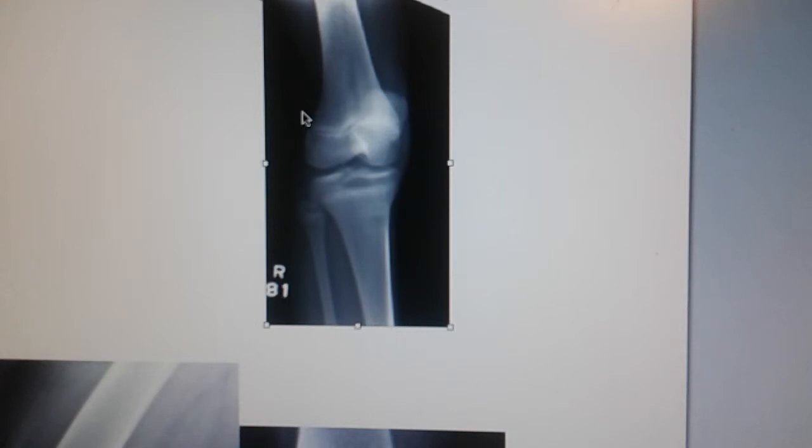I can't think of anything else except for seeing the back of the tibia, or the posterior surface of the tibia. Oh, the lateral condyles should be in profile. I'm not sure if that's how they word it in Merrill's, but it's something like that. And then, of course, the bony trabeculae and soft tissue. Oh, collimation. You want to have the knee joint centered. And you want to be able to see parts of the femur and the tibia and fibula.